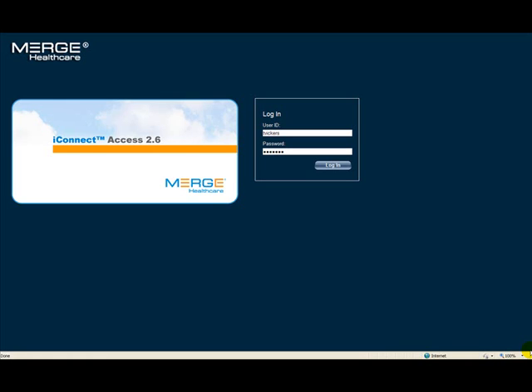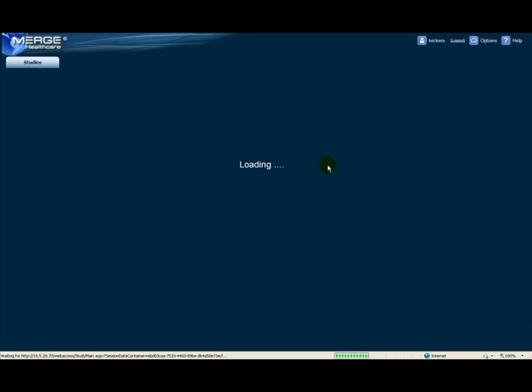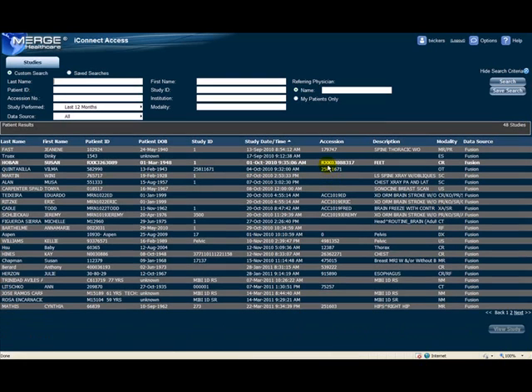In this video, we'll review iConnect Access. I'll log in with my user ID and password. And the first thing I see is my study list.